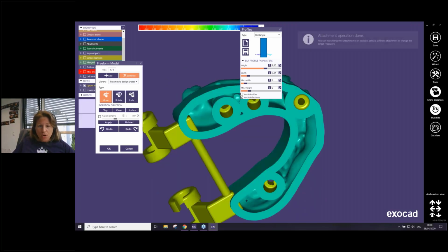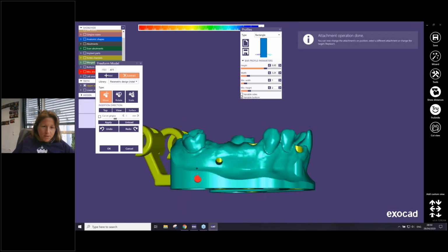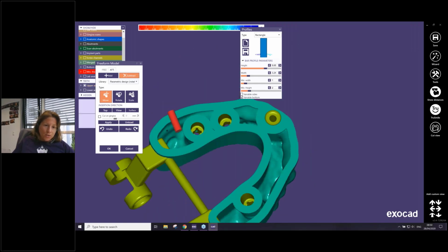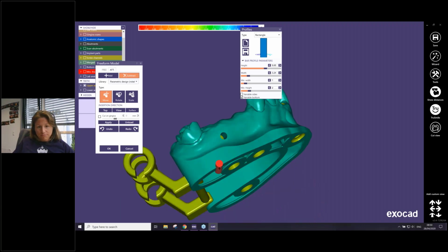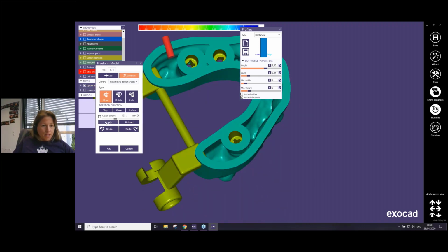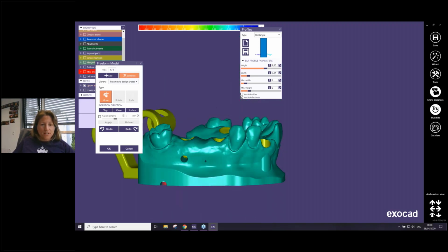Also, drain holes are possible to select. If you need one, maybe on the bottom side here, or more than one, you have this possibility here. You apply, and that's it. And that's in the free-form model step. At the end of the design, you can open the menu and change it.